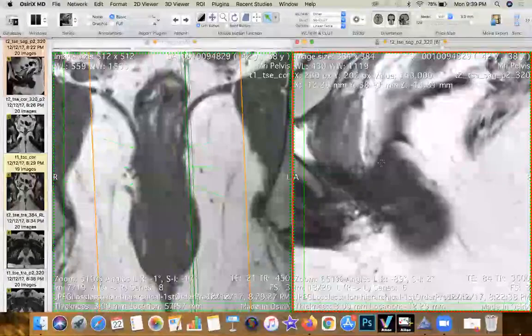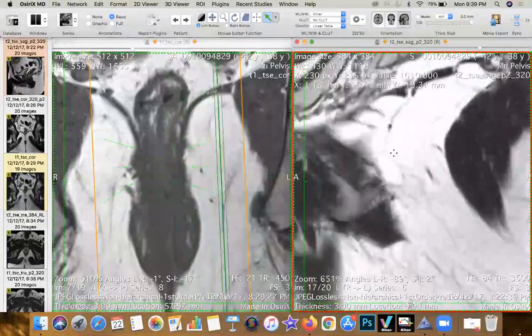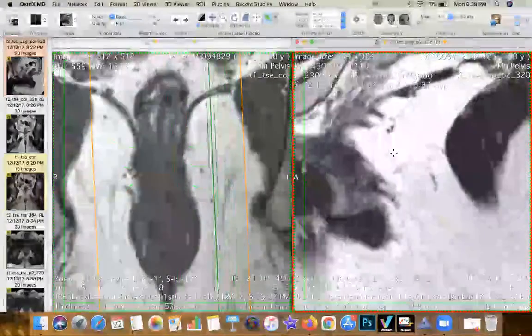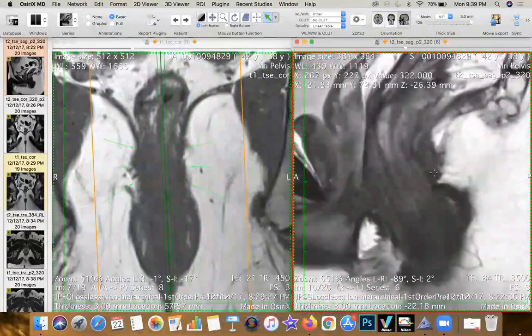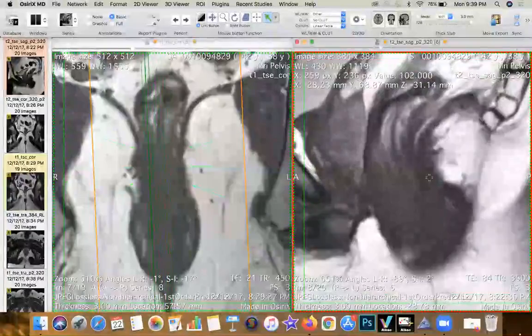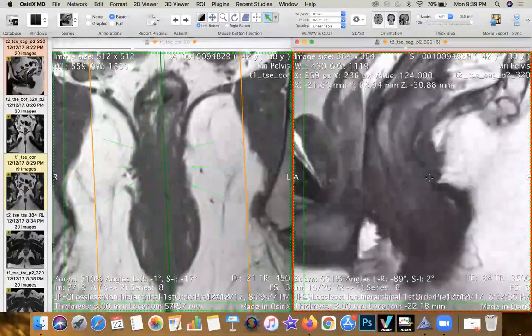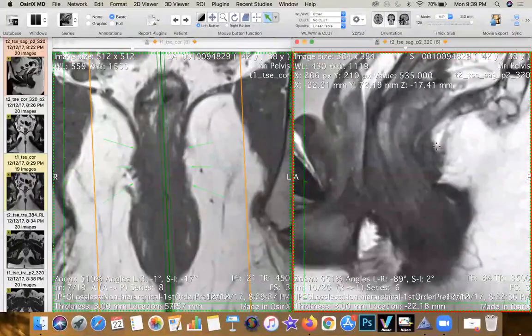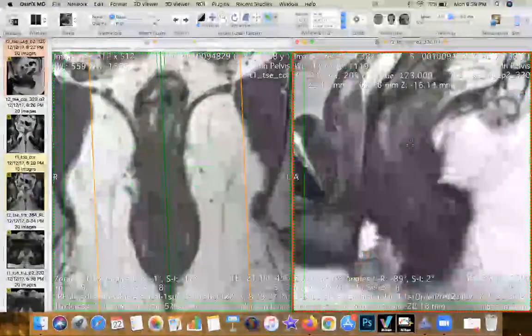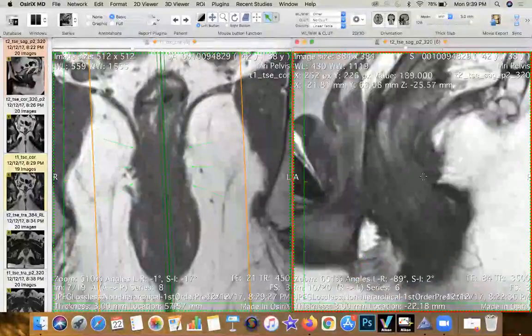You can see the fibers coming out from the ischiopubic ramus. These fibers then arc over and form a condensation along the posterior wall of the rectum. This junction, where it forms a U-shaped notch on which the rectum lies, is also called the anorectal junction.